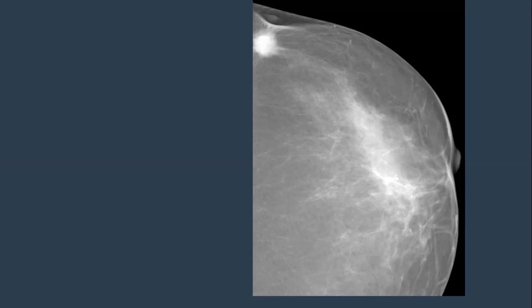Let us go a little bit quick. Spiculated mass. This is a spiculated mass, excellent, well done. Associated with skin retraction. Yes, it is causing distortion because of the desmoplastic reaction, or the spicules extend to the adjacent skin with thickening, retraction, and dimpling of the skin, resulting in some area of distortion.